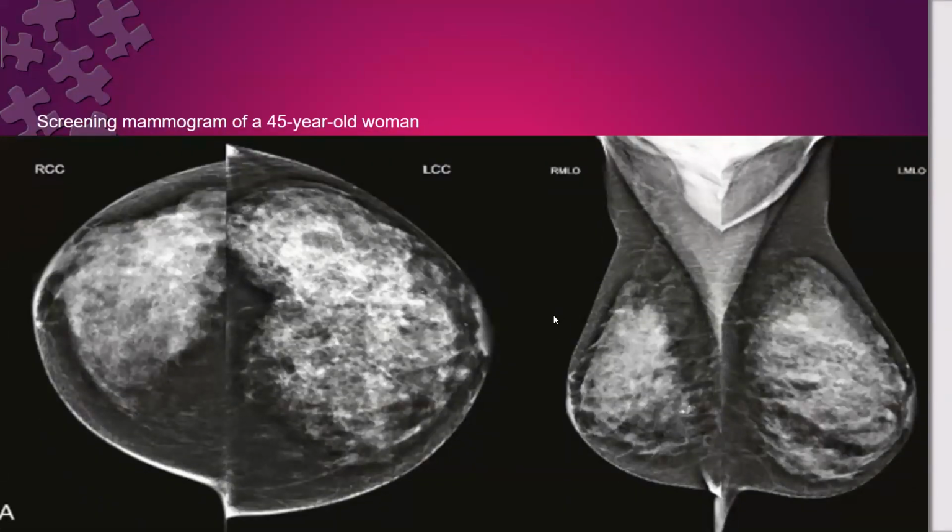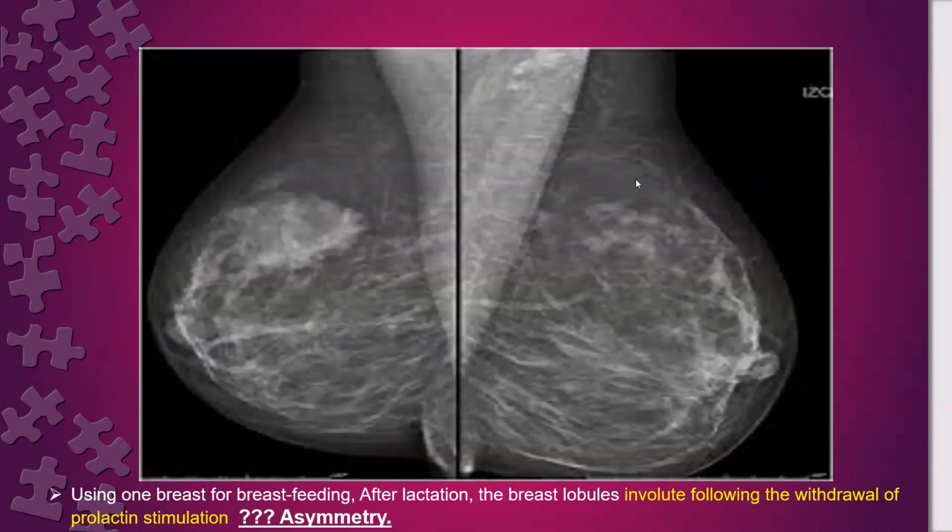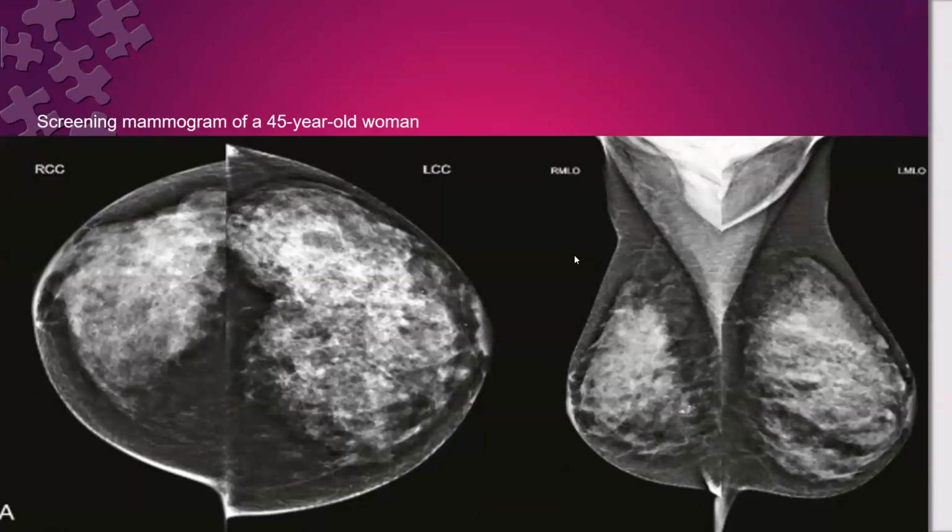Who is going to take this case? In the previous one, no calcification and no axillary lymph nodes. This one? Here? Yes, nothing. If there are lymph nodes, they might be small. There is nothing. The image is not an optimum one, but it was normal. There was no pathology related to the case.